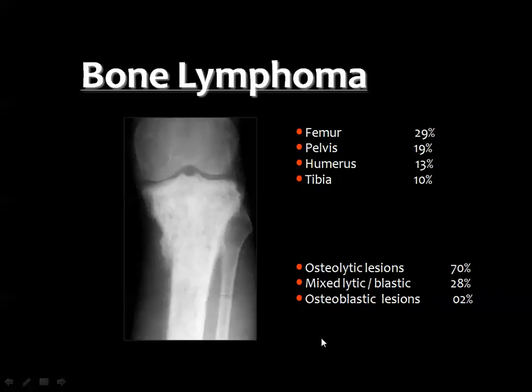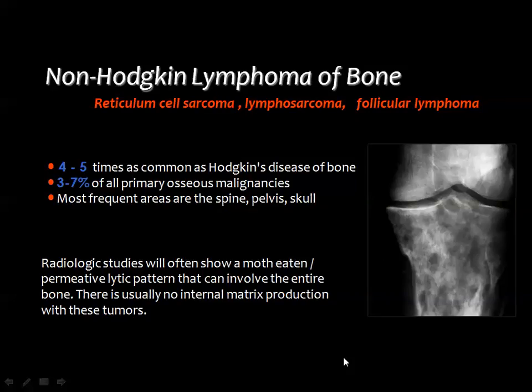Although this is stated in the literature, in clinical practice we usually diagnose lymphoma based on the presence of mixed osteolysis and bone sclerosis. And you can see here in the proximal part of the tibia, there is heterogeneous appearance of the bone texture with areas of sclerosis alternating with other areas of osteolysis.